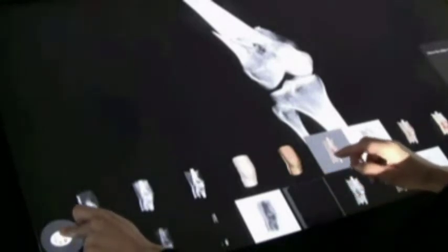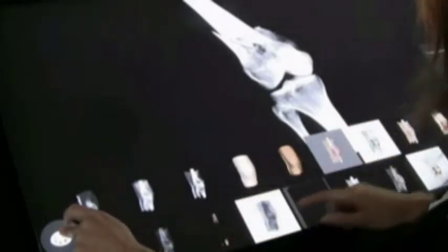For different reasons, you might prefer the appearance of an X-ray image by using something that is called presets, and that is predefined settings. You can change to a more X-ray look-alike appearance. And here you also have the presets that visualize muscles and ligaments and tendons. You also have presets for skin and air. And if I apply the soft tissue preset, I will get a good view over the soft tissues such as muscles and ligament.